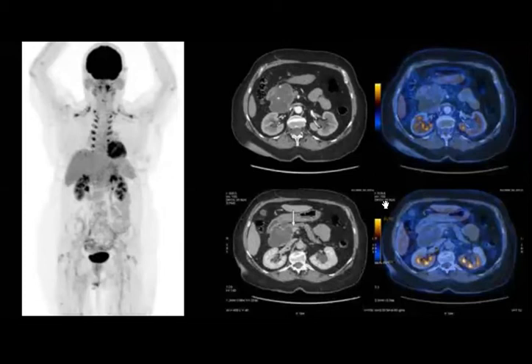No uptake. Perfect, doc. I don't know your name, so mention your name if you like. Jyotsna. Okay, Jyotsna. Thank you. And no uptake in the pancreas, so a lesion in the pancreas with no uptake, so maybe it is a cystic pancreatic tumor, like serous cystadenoma, which is the case here. So nice. So how would you solve this? What is this uptake here? Is it a metastasis? If you want to mention that this pancreatic lesion maybe has calcification, you forgot to mention calcification. It's a good sign. Yeah. Yes. Sarah again.